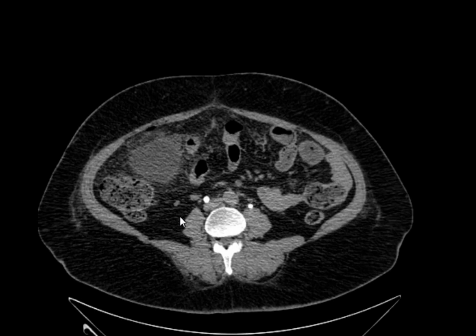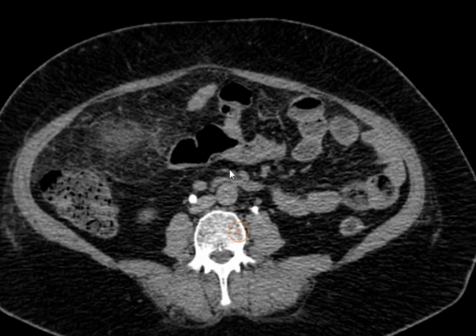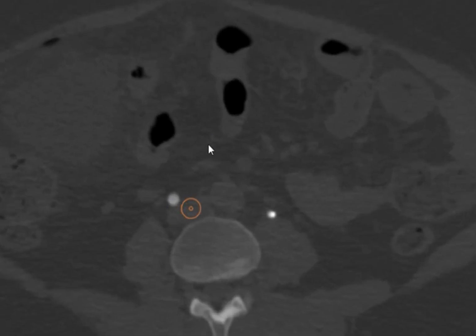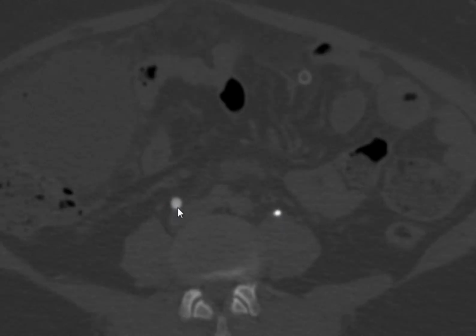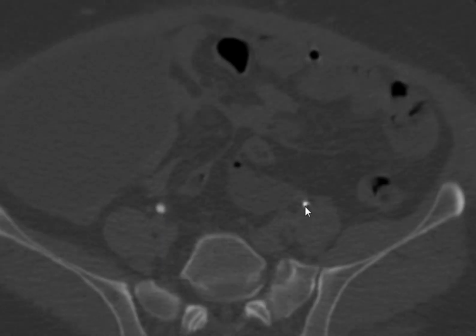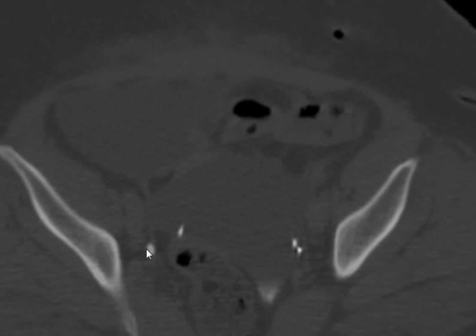It's all one big urinoma. Got it? Okay, let's see another trick. This is double J density. This is contrast density. Okay, so till here it's only contrast, only contrast, only contrast. See, the double J shown dense? This is only contrast. Till here we have nothing in the ureter.